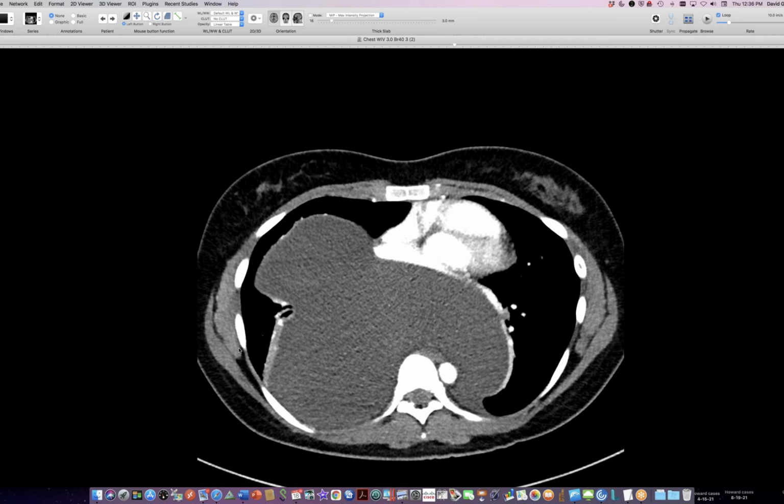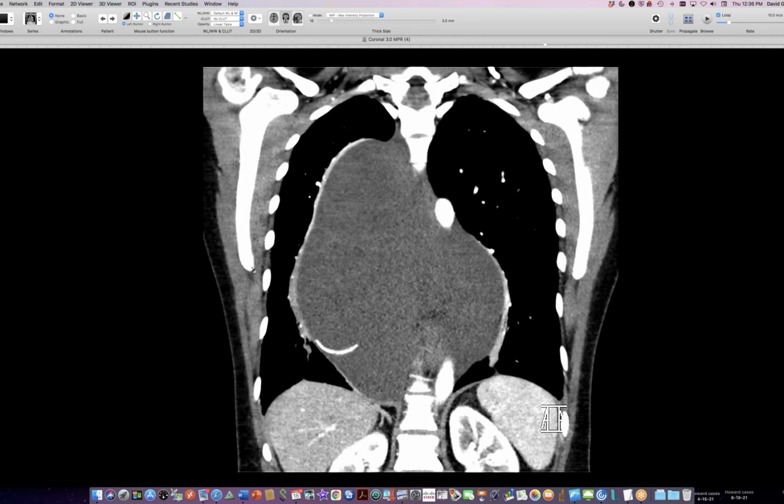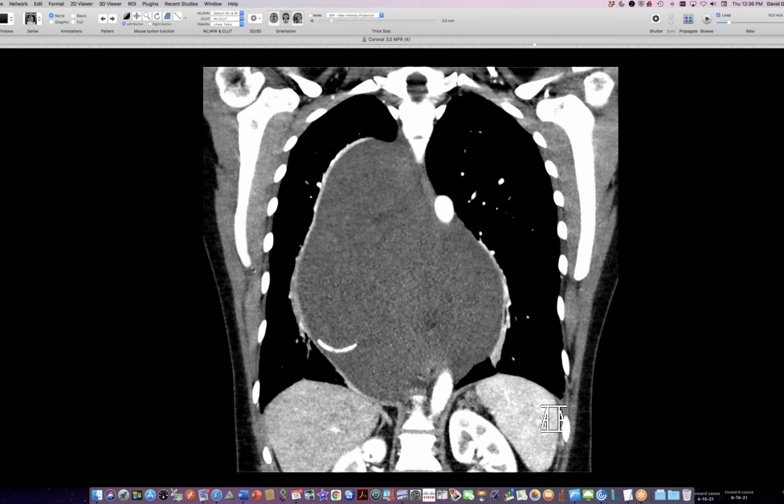And I think, by its size, this lesion has been growing for a long time. So I bet if we'd had a radiograph when she was 5 years old, we might have seen it already at that point. Oh, sure. Yeah, because they're slow growing. I've never seen one like this. The ones I have aren't small, but they're nothing like this. Gee. And all the ones I have have clear fat in them. So yeah.